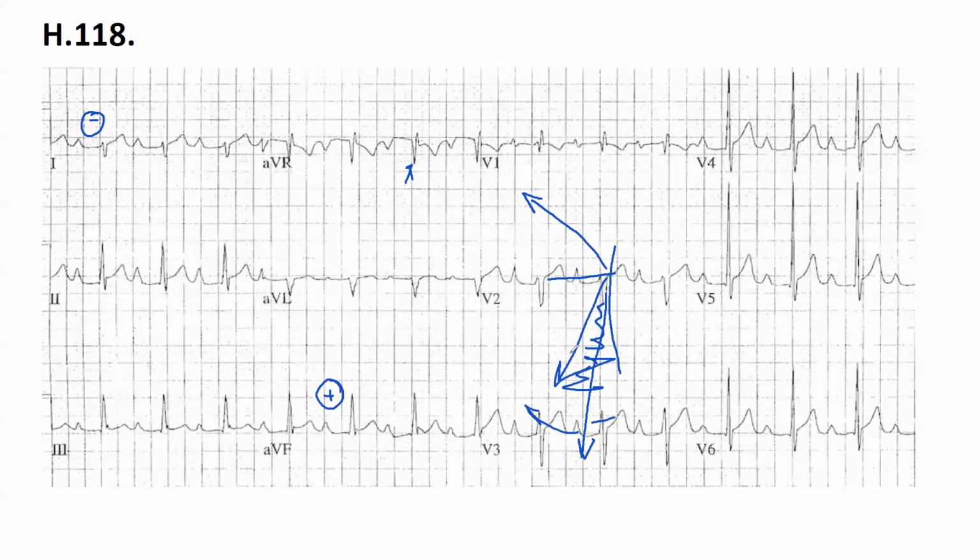So it's less than 120 for sure. Because the QRS is narrow, I think we have a left posterior hemiblock. You can assume that, yes, we do have a left posterior hemiblock. I accept it. Good.